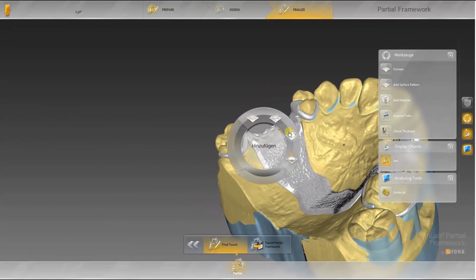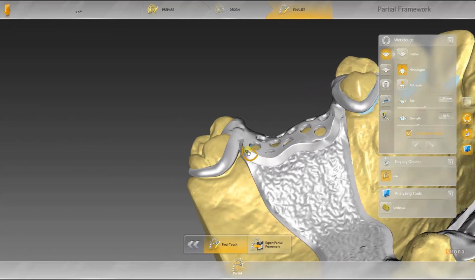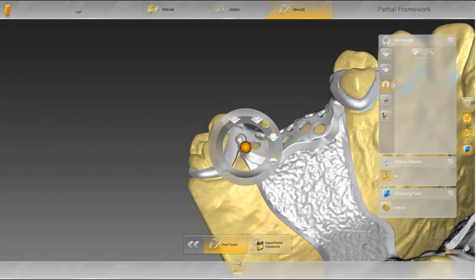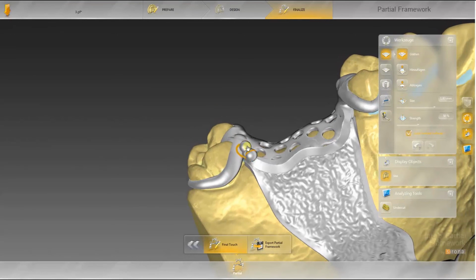Begin with applying material with the Form tool. This can be done with Form Plus. Click to place material points at the respective locations to reinforce the material. Use the Smooth tool to integrate the material into your design.